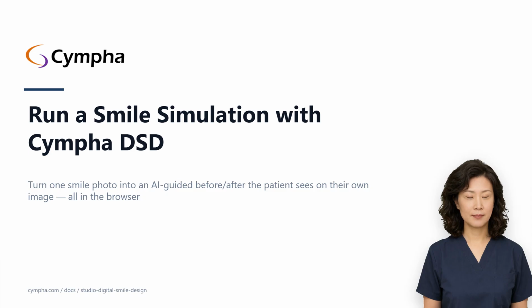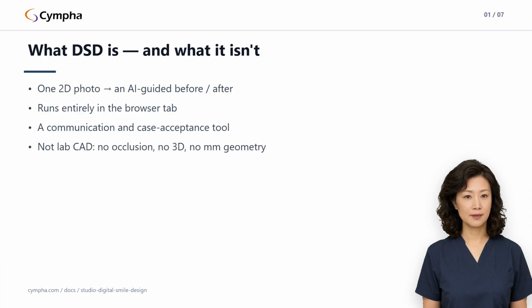First, the honest framing, because it's written right into the product. A single photo smile design is a communication tool. It's for chairside case acceptance and for showing the lab your intent. It has no occlusion, no three-dimensional data, and no millimeter-accurate manufacturing geometry, so a licensed clinician must review every result before any clinical use. Within that frame, it's remarkably capable.